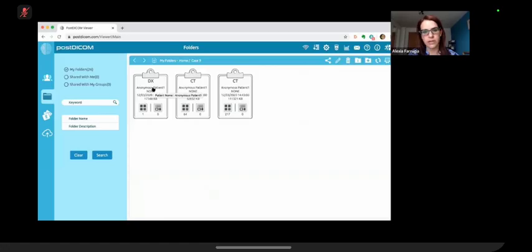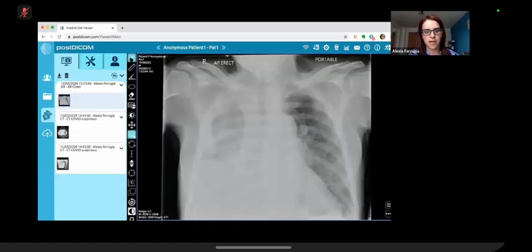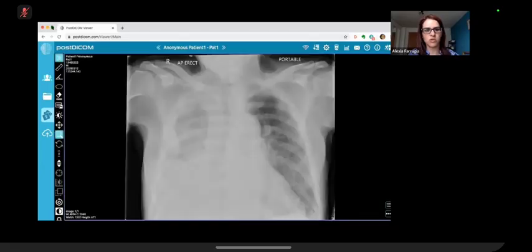So we'll start with a chest X-ray for this patient. And whenever you're ready, you can let me know what you see.